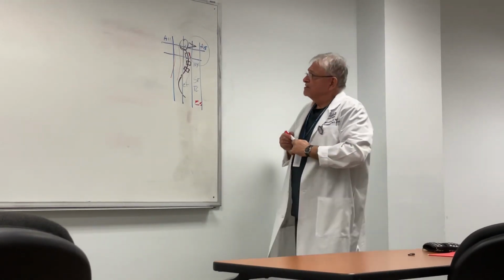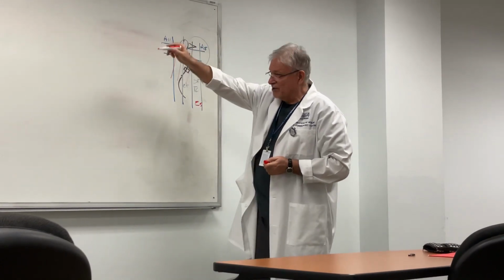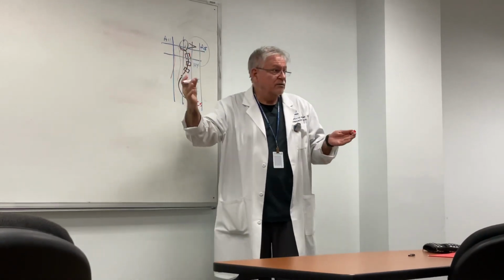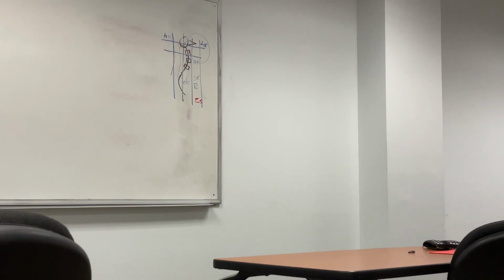Now, this is the occiput. If you said, I'm looking at the sella, and you didn't talk about the occiput, and it's on this particular x-ray that we're looking at, you've missed one important part that was there, okay? Now, I'm not going down and saying, okay, I'm gonna look for 10 things you didn't say and therefore you get 0. No. This is your first attempt at a search pattern, okay?